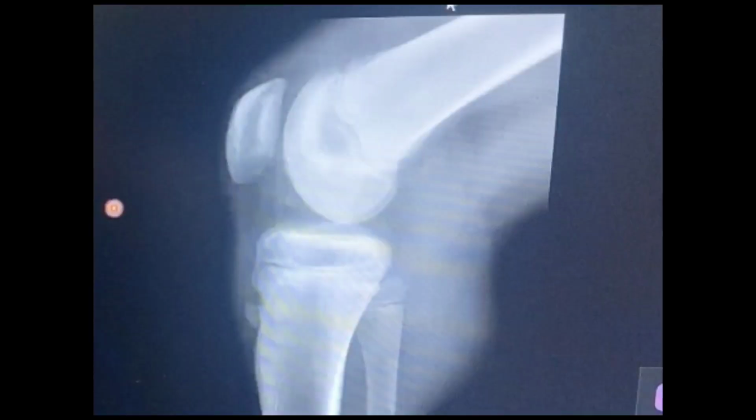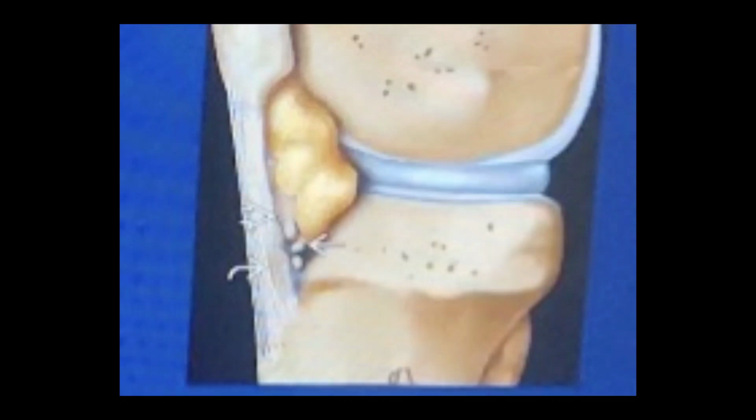On this knee radiograph for Osgood Schlatter disease, you can appreciate ossification and thickening of the inferior patellar tendon adjacent to the tibial tuberosity. On this image you can appreciate that the anterior tibial tuberosity is showing a fragmented portion, slight elevation, and irregularity, and the tibial tubercle slightly protrudes, and there is adjacent soft tissue swelling. So this radiograph shows Osgood Schlatter disease clearly.